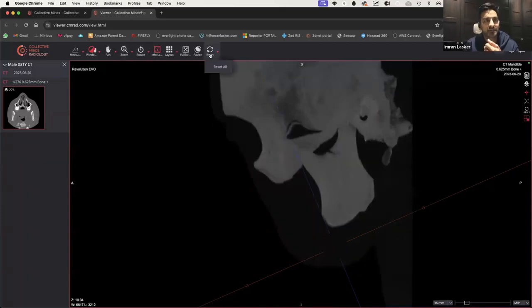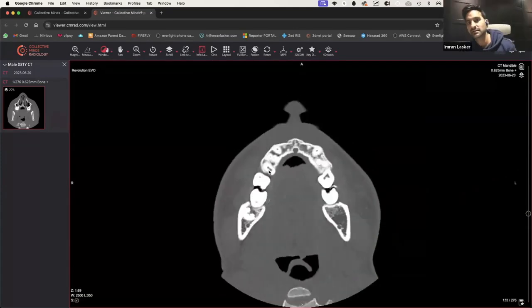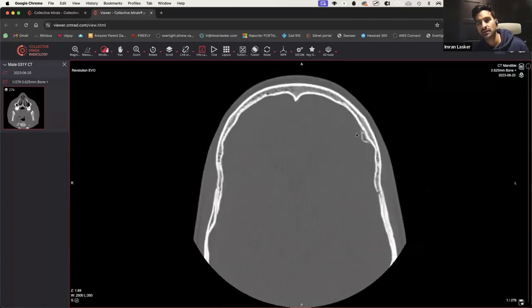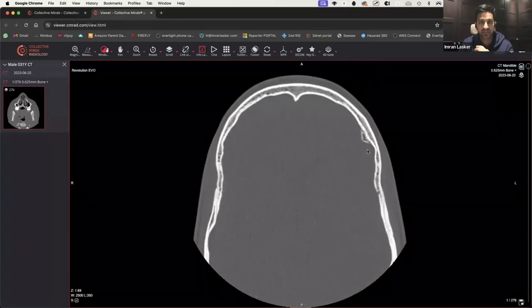And if we just reset everything the way it is, meningioma, let's have a look actually. You see that? Meningioma frontal lobe. Someone feels as though they saw a meningioma. This one here, yes, it could be. You could get a calcified meningioma, very, very commonplace. It does look like it's extra-axial, and there's probably going to be a bit of CSF space between this and that, so it's more likely to be one. Would I be worried about it? Not really. It's probably not causing enough mass effect to be causing any major issues.